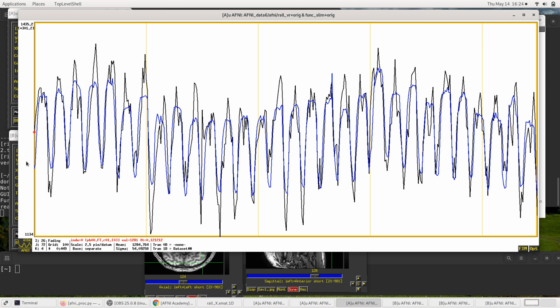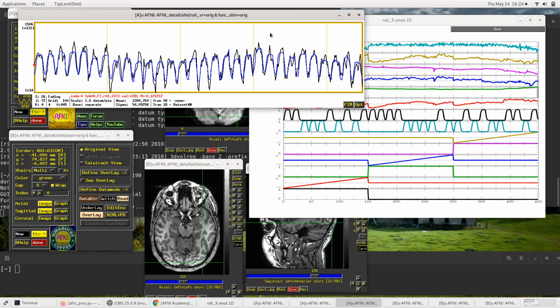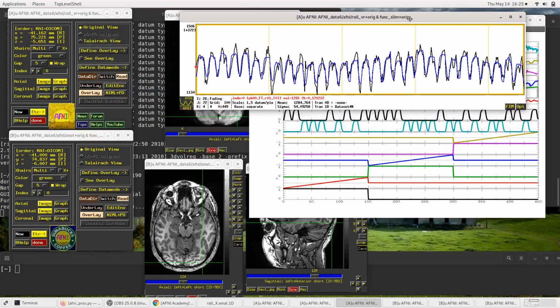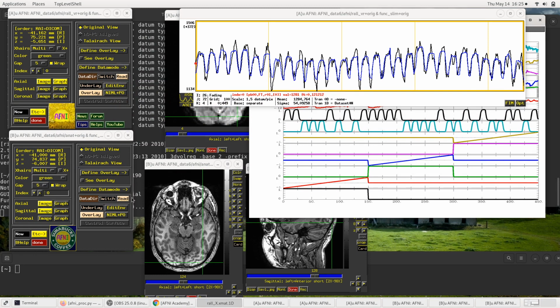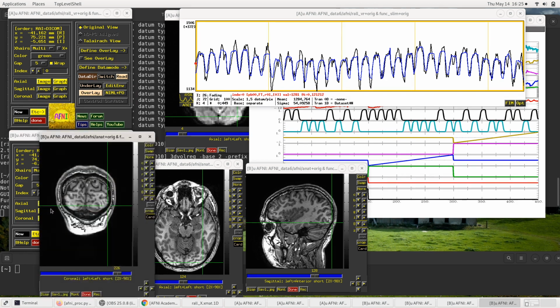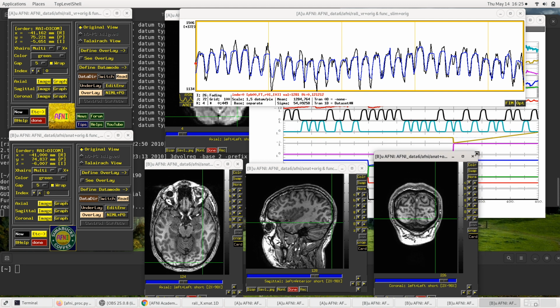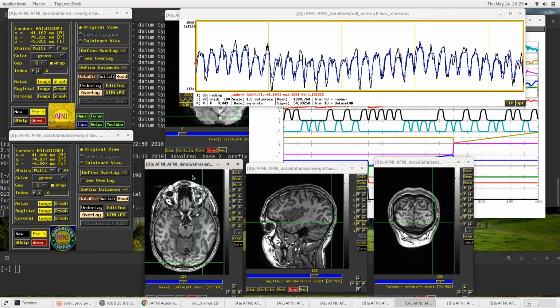Anyway, fantastic. So you can actually see how big the beta weight is when compared with the data. Okay, so I'm going to make this a little bit smaller, and now let's go exploring the actual beta weights and statistics in the other controller. So we'll hop down to controller B, and I'll even open all three windows there, but I'll make it a little shorter because I want to see the other windows.